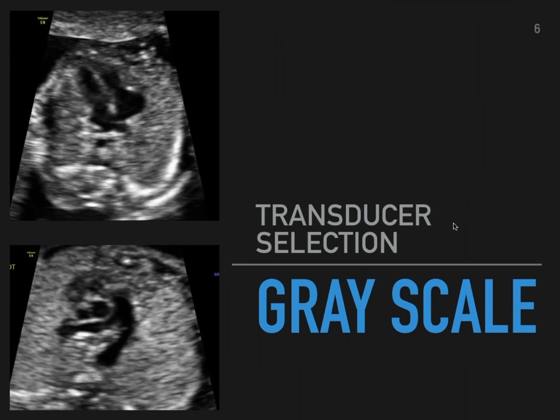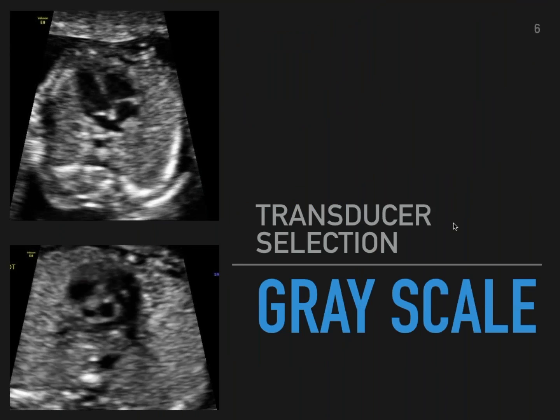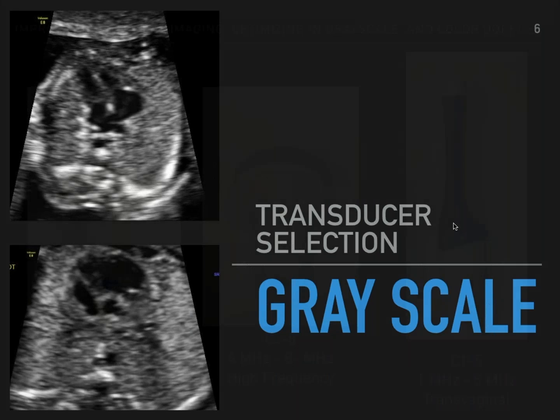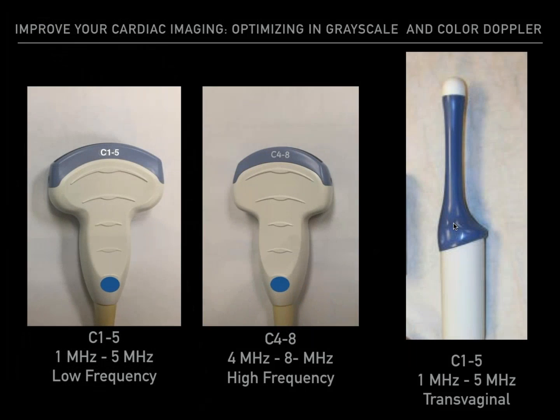In this first section, we'll discuss transducer selection in grayscale. Frequency selection is dependent on the type of ultrasound transducer you would like to use. Here are a few of the different types of transducers utilized at our units. All have different operating frequencies that you can see at the tip of your probe or at the base of the plug, and all have different capabilities.